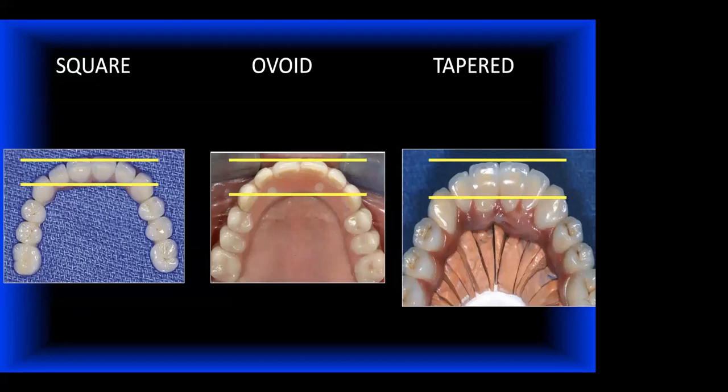You look at a line that goes from the tips of the cuspid to the facial aspect of the central incisors. So the square has a very small space from the tip of the anterior teeth to that cuspid. Whereas if you go all the way to the tapering, it's a larger space. So what is significant about that? That is all the cantilever.